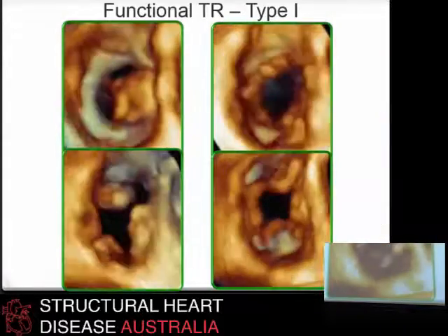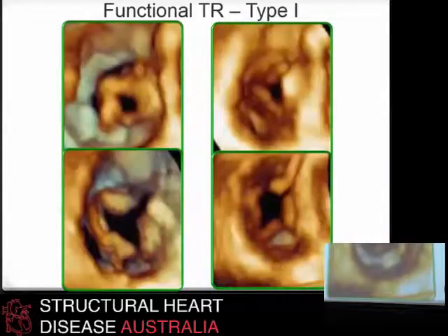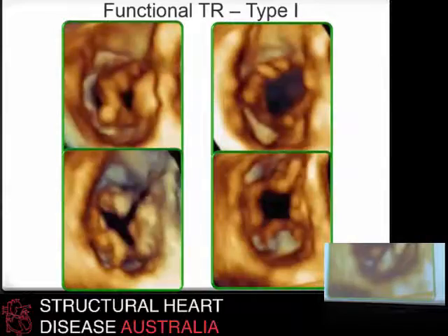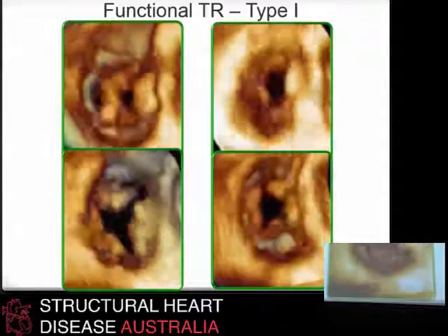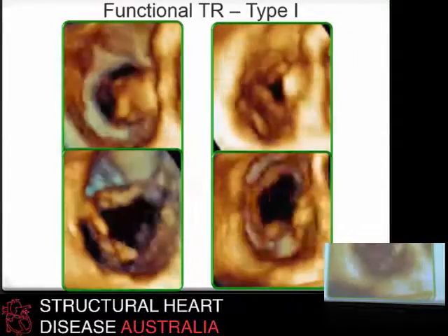Here are some nice three-dimensional images of annular dilatation of the tricuspid valve, demonstrating poor coaptation of the leaflets. And in some examples, you can see how a bicuspid appearance has developed.